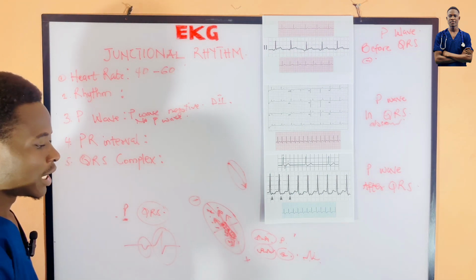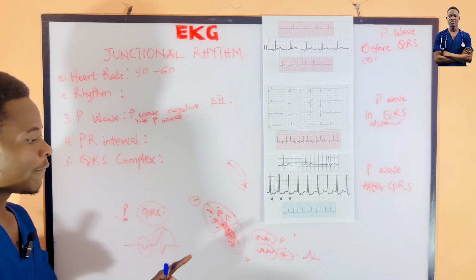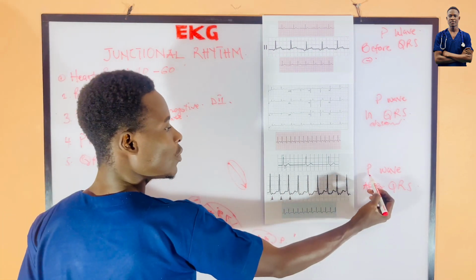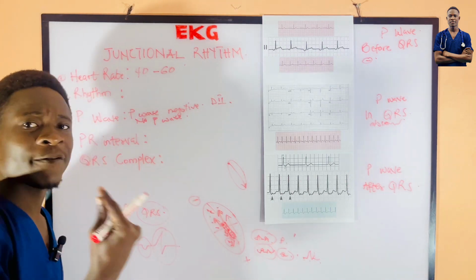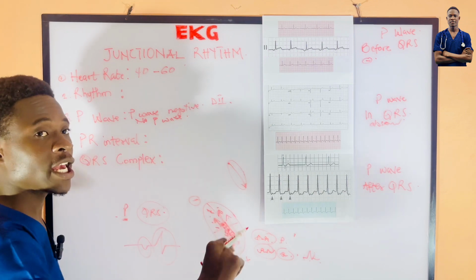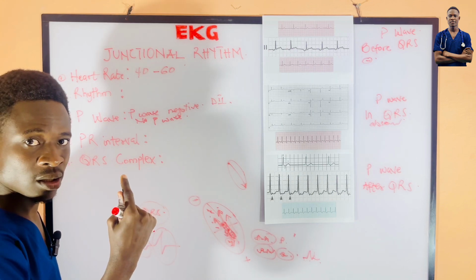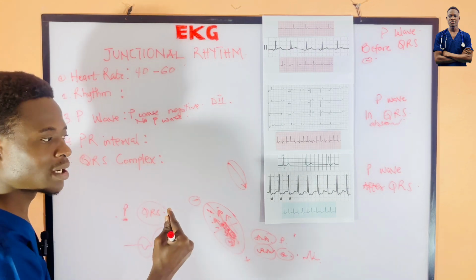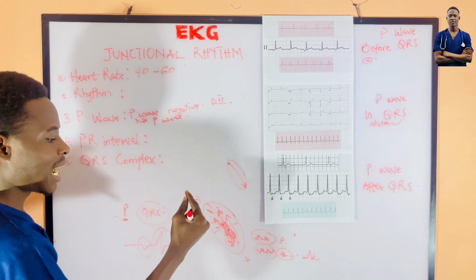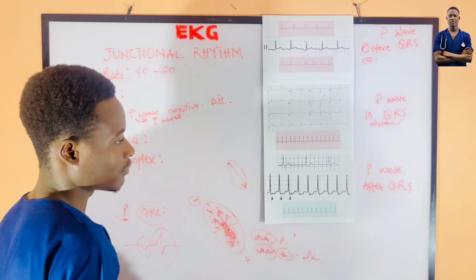So because of that, the ventricular contraction will be happening first before the atrial contraction. So for that one, the P wave will be happening after the QRS complex. So if you take the graph, you see a QRS complex first before a P. Do you understand? Before we see the P wave. That must tell you that the P wave generated was at the latter part of the AV node. Are we clear with it? Now, let's look at something here.